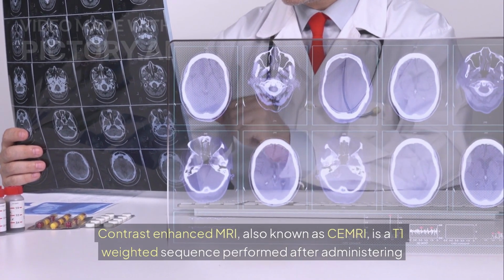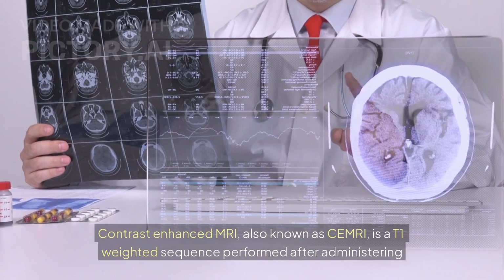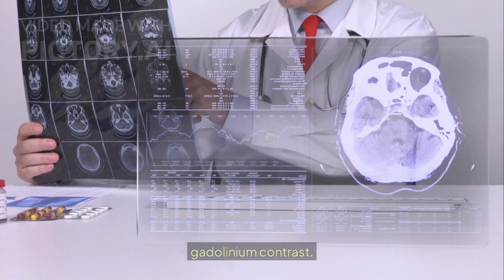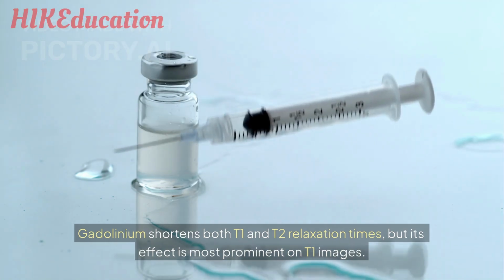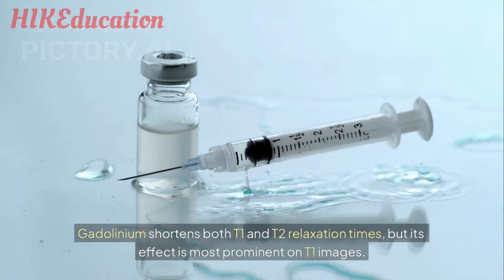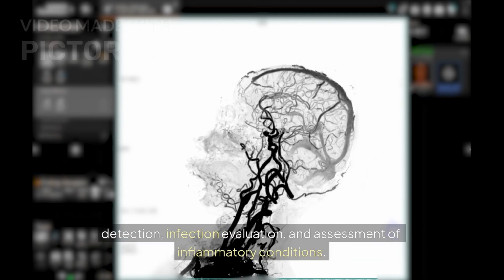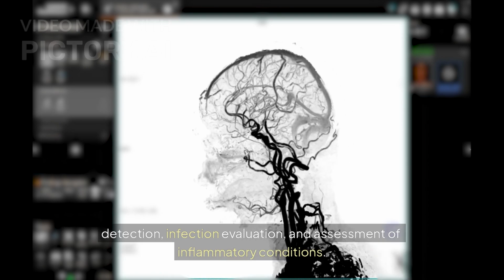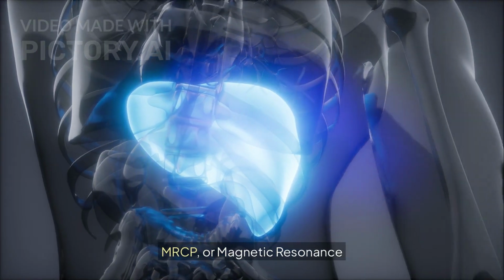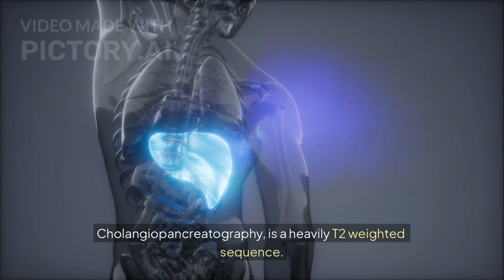Contrast-enhanced MRI, also known as CE-MRI, is a T1 weighted sequence performed after administering gadolinium contrast. Gadolinium shortens both T1 and T2 relaxation times, but its effect is most prominent on T1 images. Areas with increased vascularity or breakdown of the blood-brain barrier appear bright, helping in tumor detection, infection evaluation, and assessment of inflammatory conditions.